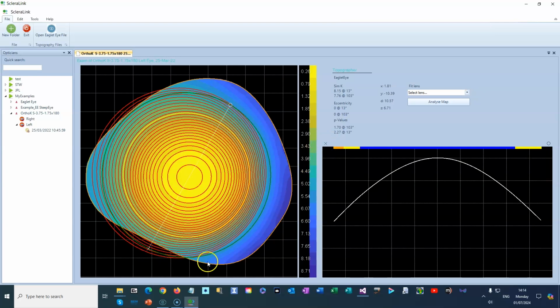I am away from the raw data, but I am still showing the profile because the orange part of this little bar here tells me that I am using extrapolated data. So I have mathematically extrapolated this area here to fill in for my required lens diameters. And similarly, I don't think we quite reach it. No, it doesn't matter over there. So there we are like that. So this is a perfectly nice profile.